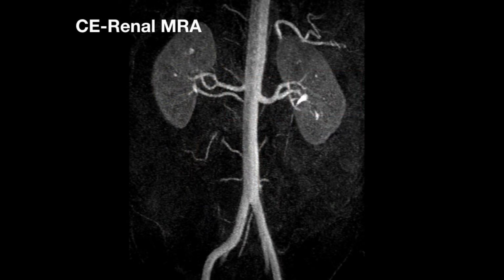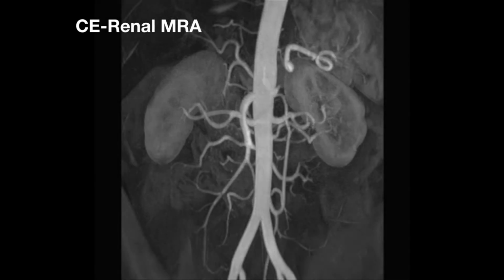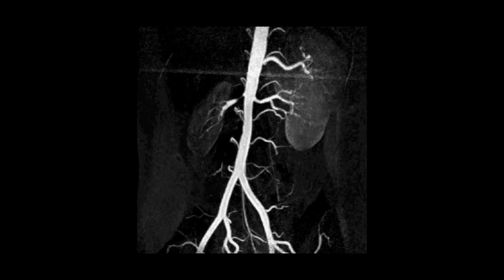Doesn't mean they can't give the left kidney, but it would preclude them from taking the right kidney. And just to show that's 3D, we'll move on. And just to show that this is vendor neutral in some respects, okay? So previous was vendor A, this is vendor B, but we can get just as good images from vendor A, B, C, or D, okay? This one is actually with Dixon, so this doesn't need a mask, but we get the same from all of them. And we can show pathology, okay?